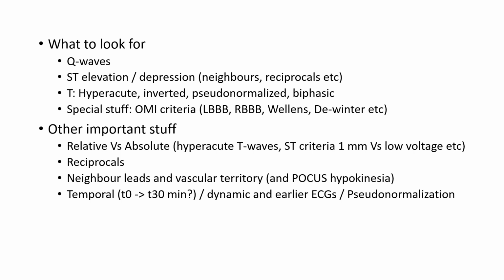We'll see that. And I always stress the importance of these things here. So ST segments are not an absolute thing. I know the ST criteria wants you to think that, but it's not. That's why we want to move to the OMI criteria. So 1 millimeter of absolute ST elevation, yes, but if it's low voltage, or especially in the inferior leads, then it may not be 1 millimeter.